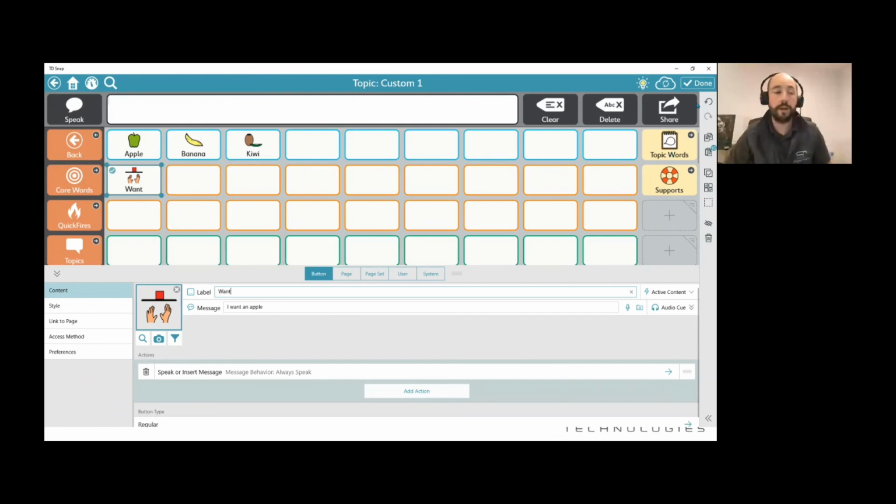For anyone who has a progressive condition, for example MND, you might need to do message banking. You can do that as well, and you can add those buttons to the software. You can save the message banking messages on a MyTobiiDynavox account, transfer them over to the software, and we can add them into the buttons. So we can actually have those specific messages that we've recorded, and we can put them into our particular categories or pages and so on and so forth.